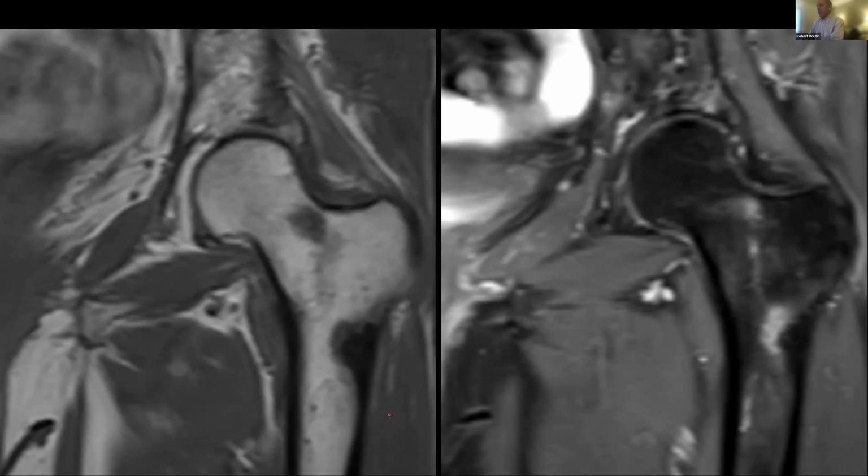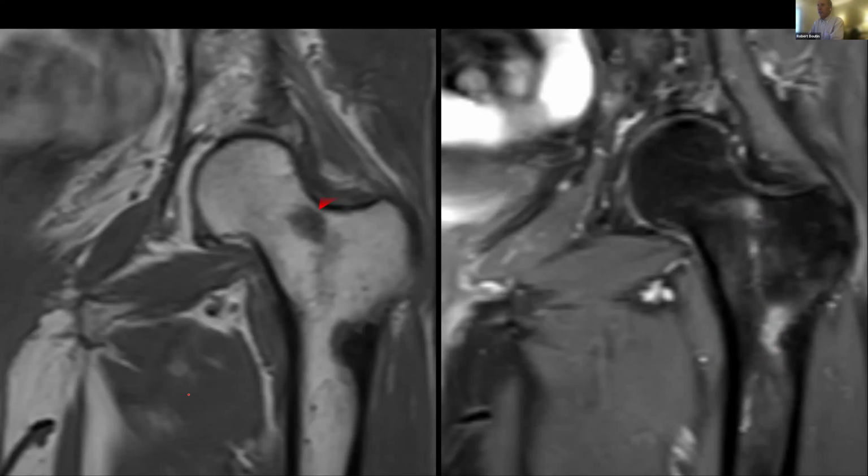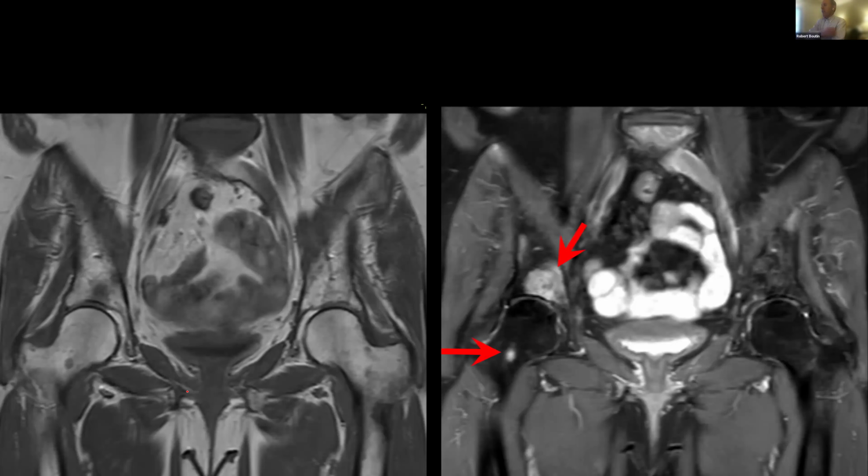Well, an MRI was performed, and you can see something called a halo sign. So here's that sclerosis, but then here's this bright T2 signal adjacent to not just one, but actually 2 lesions involving the hip. And this halo sign is something that is seen with metastatic disease rather than a bone island.